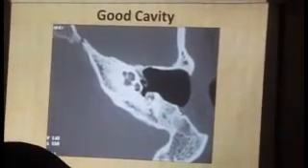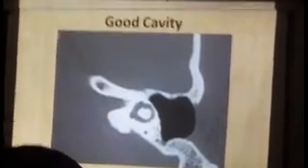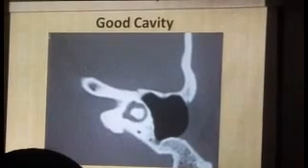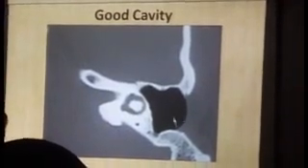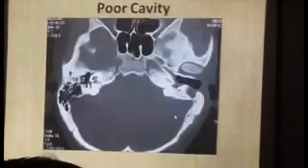That's your facial nerve, and look at the meatoplasty. Same thing. Look at the wide meatoplasty. This is much higher above. So the cortical bone has been removed remarkably well to give us a wide opening into the cavity.